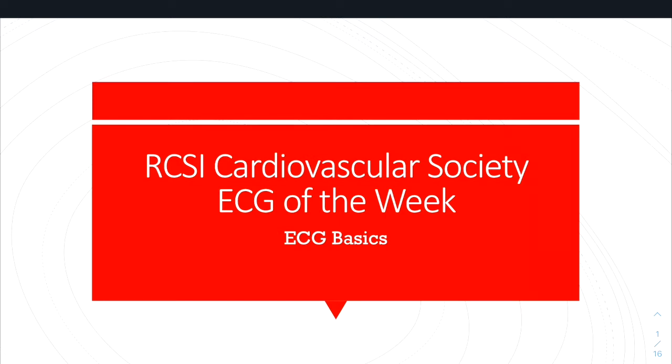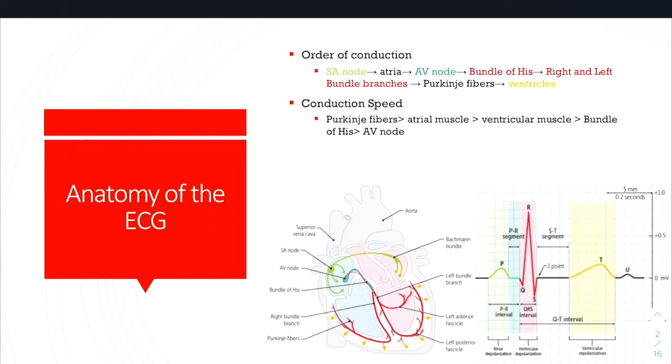This week, we're going to kick off with ECG basics and just do a quick review of some of the core concepts of reviewing and interpreting ECGs that we'll be using on a weekly basis with some of our other cases that will follow in the series of ECG of the Week. So, to get started, here's the anatomy of the ECG.